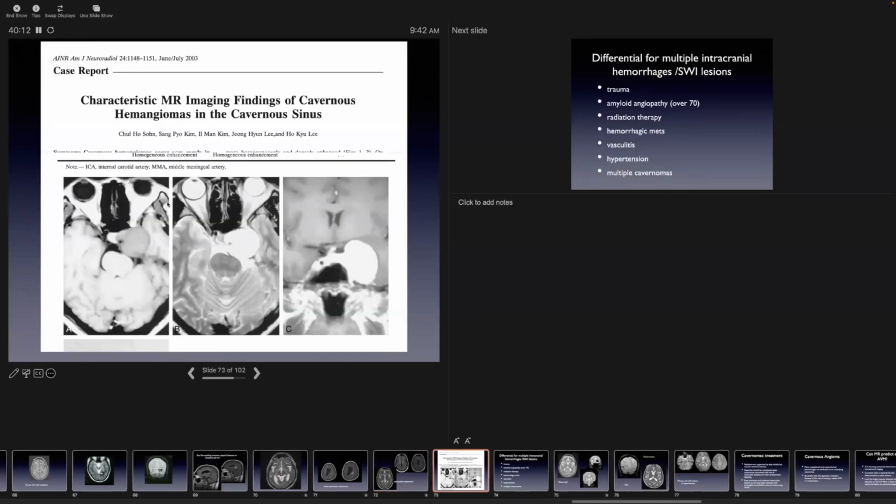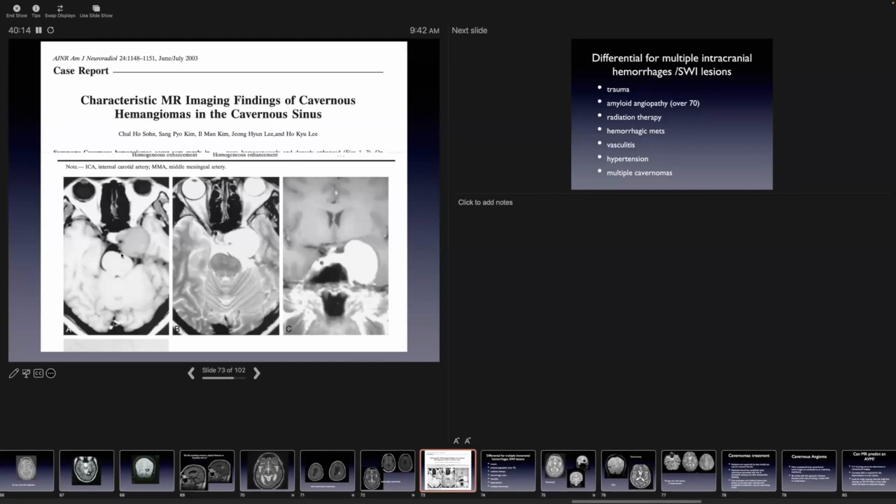I just want to bring that to your attention. We saw a case like this recently, not as large as this, but it was initially thought to be a cavernous meningioma. But if you think you're looking at a cavernous meningioma and it's bright on the T2 scan, so it has a long T2 relaxation time, you should consider the possibility of an extraaxial cavernoma, and that is a don't touch me lesion.